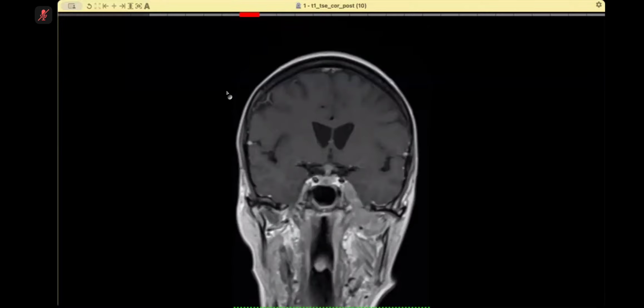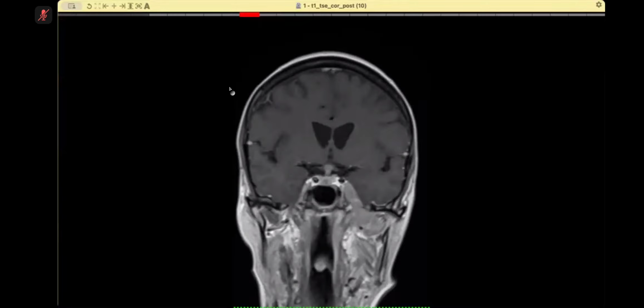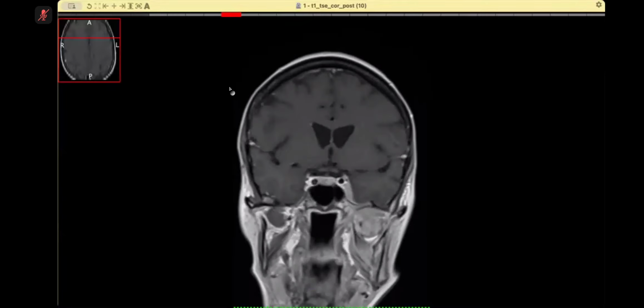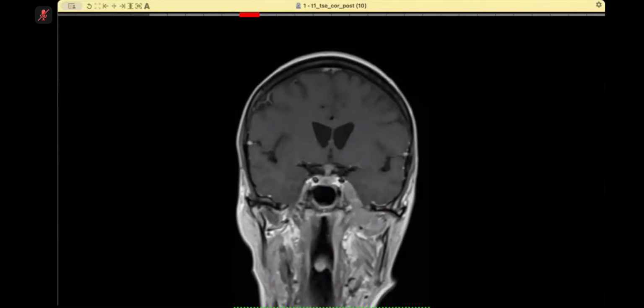So is that direct involvement or not direct involvement? I think it's a direct involvement. It is a perineural spread via the nerve into the intracranial cavity. Okay, thank you.